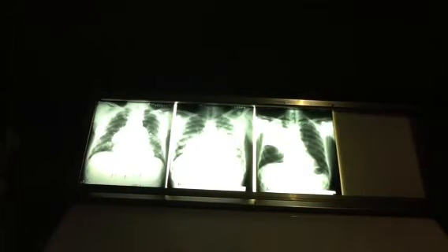Dr. Rook, what was the fluffy pattern again? So this is alveolar airspace. Okay. So Dr. Fox makes a big deal out of the sizes of these nodules, right? So if the nodule is bigger than 5 millimeters, it's definitely alveolar airspace.